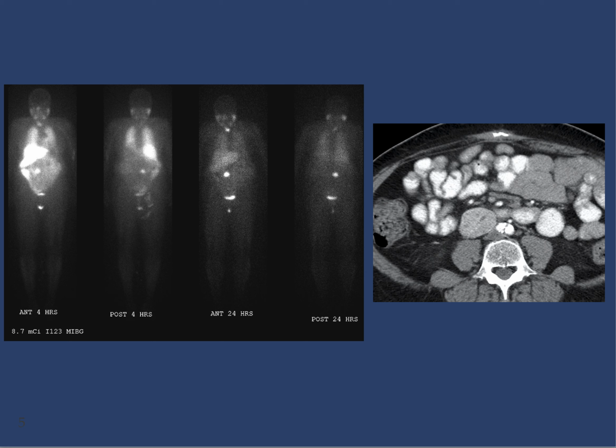This is another MIBG scan. We can see that there's a paraganglioma. It's located inferior to the renal veins. Actually, this is the most common location for paragangliomas. It's not the organ of Zuckerkandl, as written in many books and articles. In the largest studies, the paragangliomas tended to be most often found inferior to the renal veins, and we can see really nice localization. Certainly here we did not do a great job of blocking the thyroid because it's showing up as well.